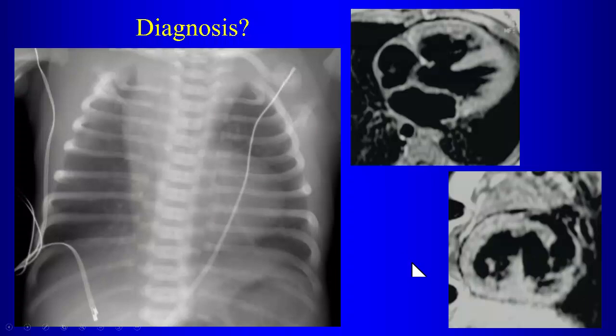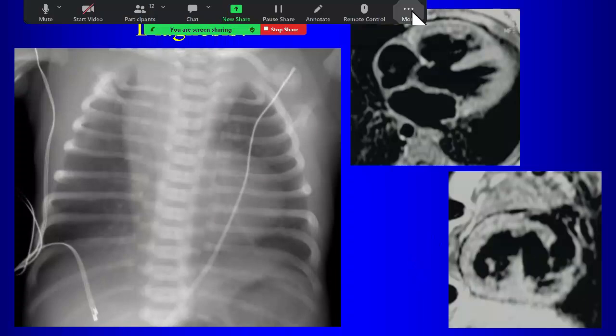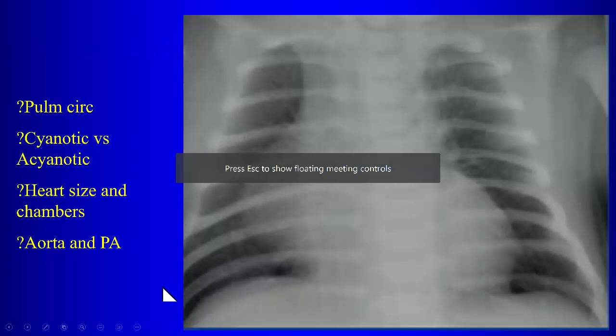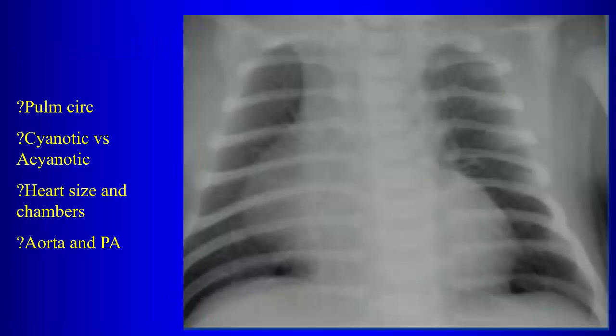It's going into the aorta from the right ventricle, okay? Okay, this guy, pulmonary circulation, little puff. Let's say it's decreased. Okay, good. So the patient is cyanotic. What do we think of the heart size here? Big. Right atrium is enlarged. Right? So what are you thinking about here? Yeah, it could be Epstein's, right? Is there anything else it could be? What did we say about hypoplastic left heart? What do you have to have there? Failure, right? You want failure there, okay?